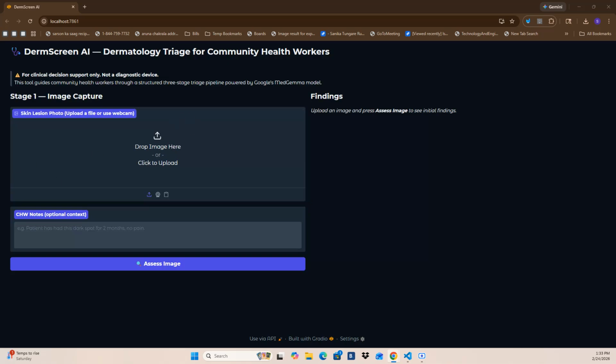This is a demo for a MedGemma model, which is by Google, and the reason for this demo is Kaggle. Kaggle has hosted this competition via Google, and I am just trying to demo the MedGemma model. I wrote the code for this to show how the MedGemma model is useful.